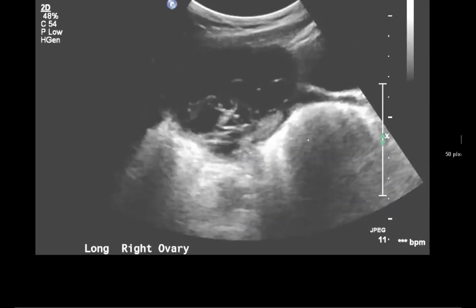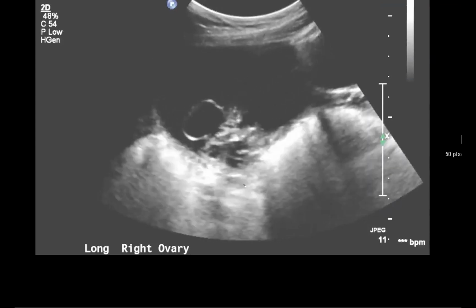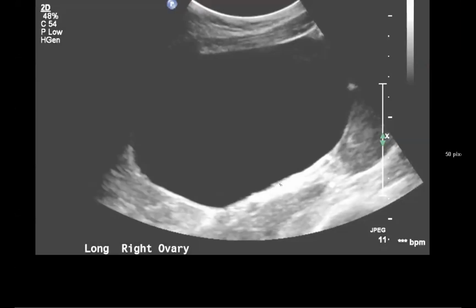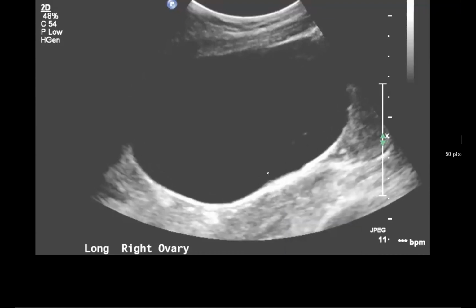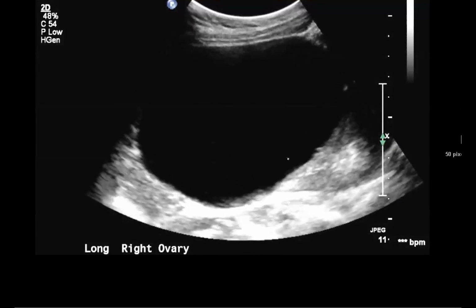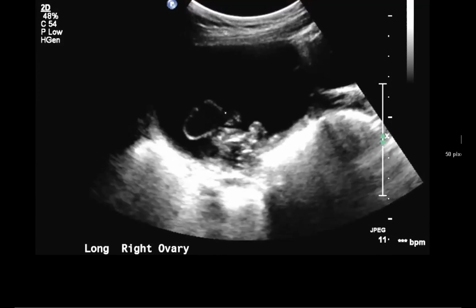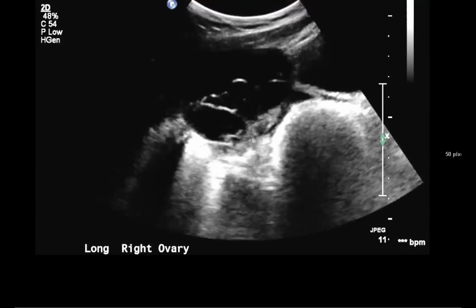Okay, this is the cine. So you can see there's a lot of soft tissue and cystic spaces in this part of this large adnexal cystic lesion, and then there's other bright echoes in there. Harder to see on the cine, but we saw a lot of little echoes on the still images, and then we see this solid component here that did have vascularity in it. So what are you guys thinking?